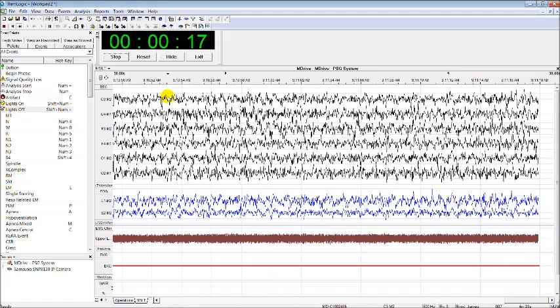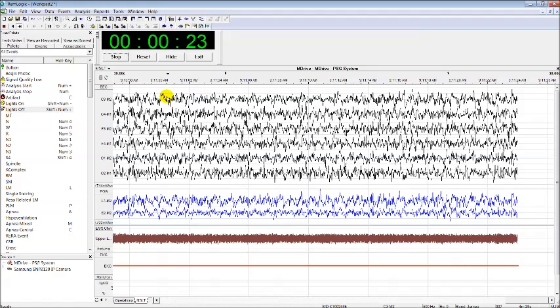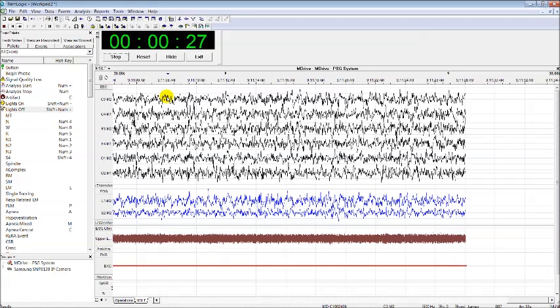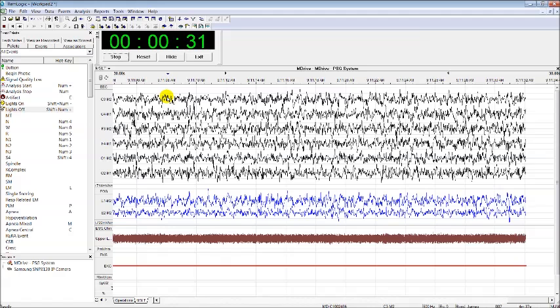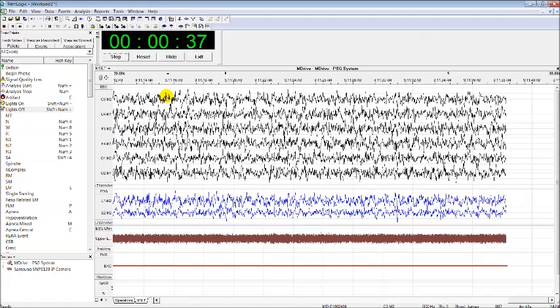If you notice there's one sleep stage, there will be an additional 15 minutes to be recorded. Okay, so the next step is you will need to score each of the naps. We can do the scoring on the go, so I'll show you how to do it now.